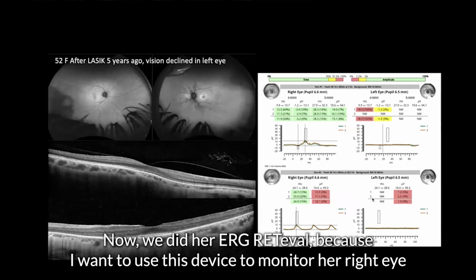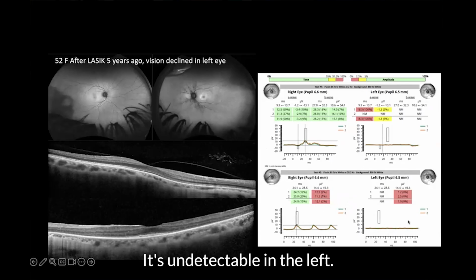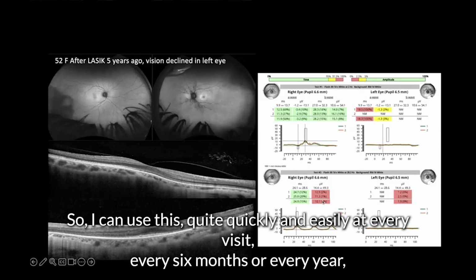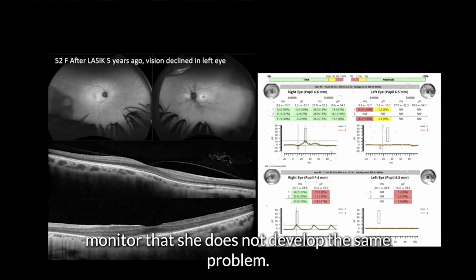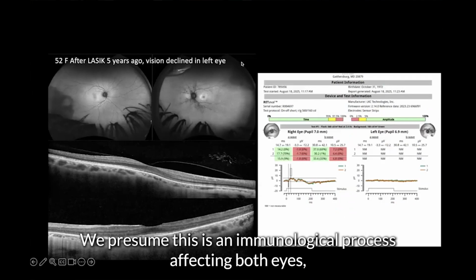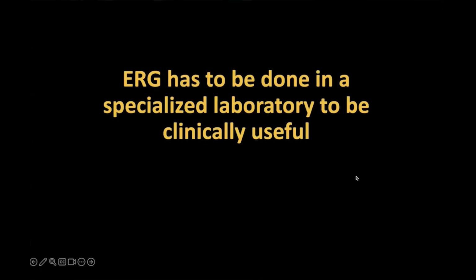Now we did her ERG with RETeval, because I want to use this device to monitor her right eye. And I can see that her 30 Hertz flicker amplitude is already reduced in the right eye. It's undetectable in the left. So I can use this quite quickly and easily at every visit, every 6 months or every year, depending on the symptoms, to see whether there's progression in her right eye. Make sure she does not develop the same problem. We presume this is an immunological process affecting both eyes, but asymmetrically and symptomatically only in the left.